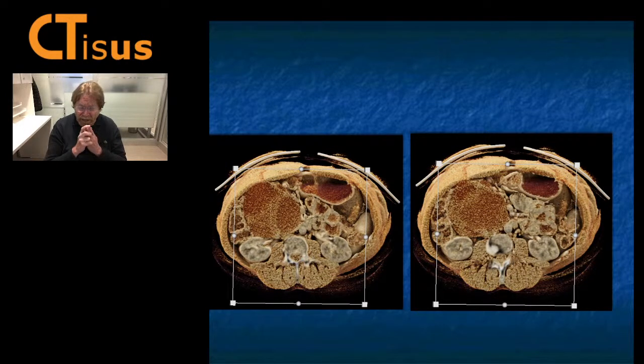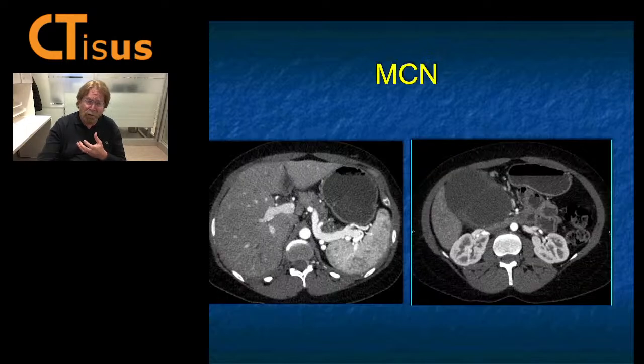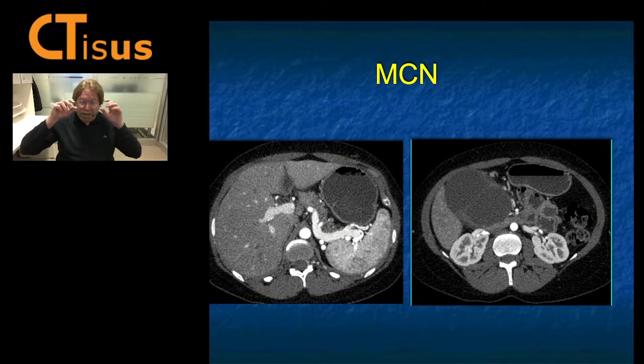So serous adenoma, what other cystic lesions? Cystic acinar cell, usually more solid component. Mucinous cystic neoplasms are cystic with septations, but it's usually a 40-ish female and it's in the body of the pancreas. Well, guess what? Not always in the body of the pancreas, it can be in the head. This was a patient with an MCN, mucinous cystic neoplasm of the pancreas with low-grade dysplasia. Just a terrific case, making you think beyond the box.